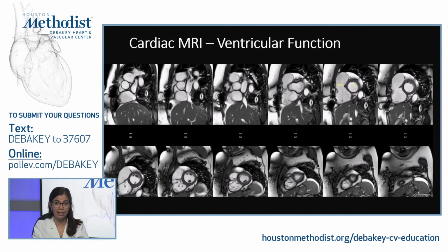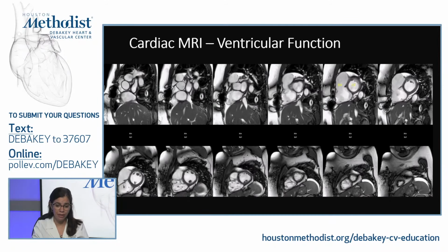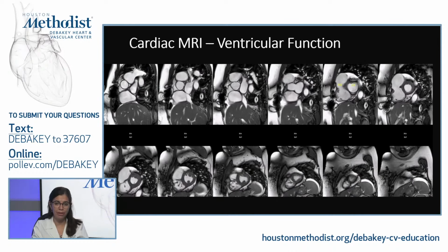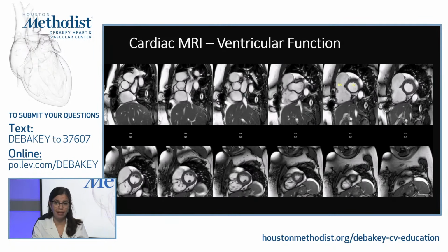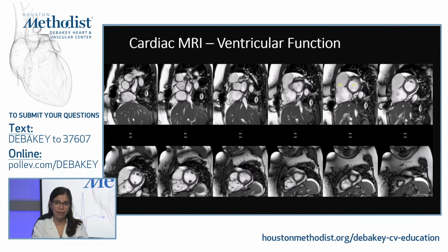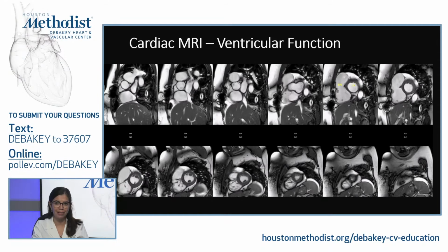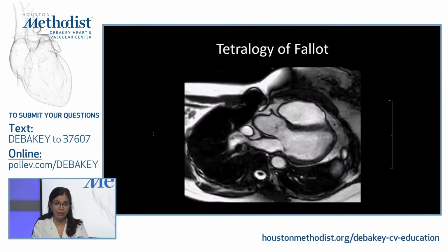This is a short axis stack across the ventricles, and you can see here a severely dilated right ventricle. Also, if you look at the labeled image of the RV, you can see that there is a patch that is dyskinetic in systole. All part of our assessment.